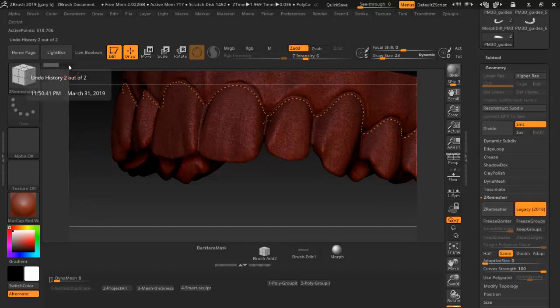So we'll do it again, and we're also keeping an eye on the bottom here to make sure we're not getting any shrinkage. I'll see if I can edit the video and maybe put a marker down here and one up at the top, then switch back and forth, and you can really see.